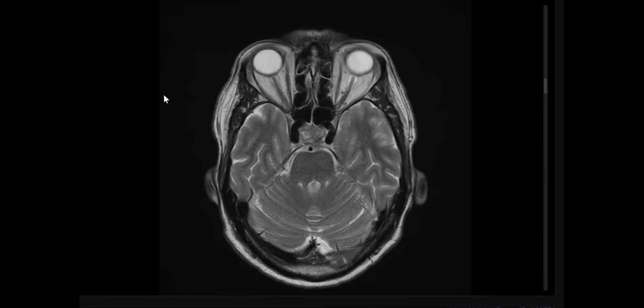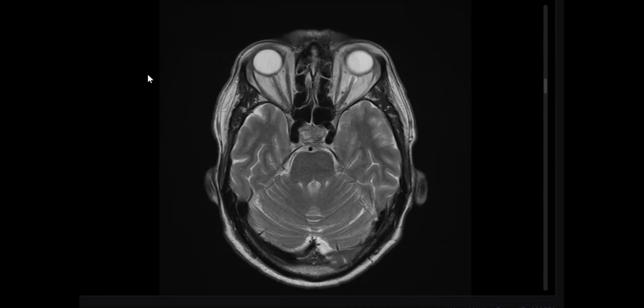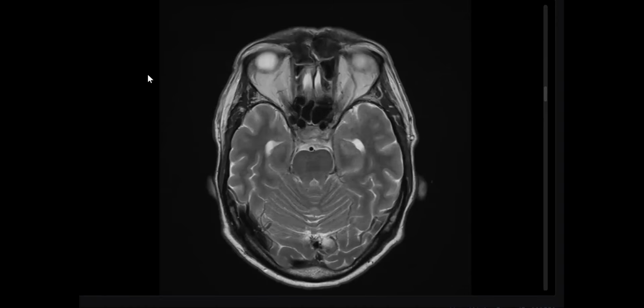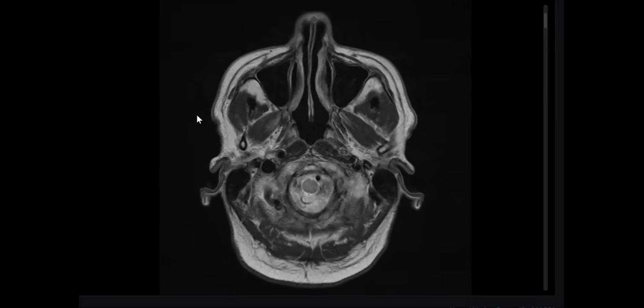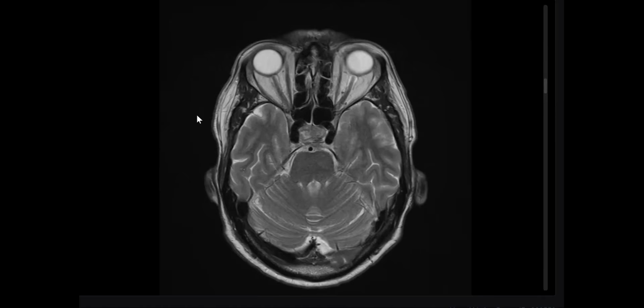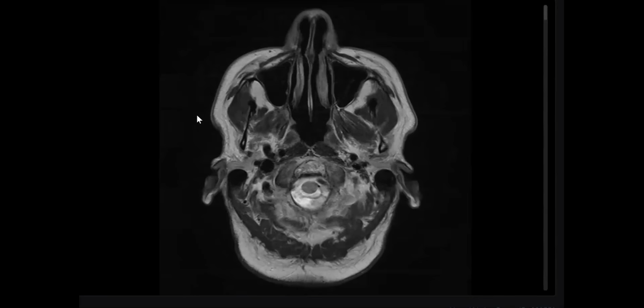For example, the venous sinuses, the suprasellar region, also the orbit, the brain cisterns, any vascular abnormality if I can spot something like this. I'm trying to check for the vessels here in the region of the internal carotid, also the basal cistern and the foramen magnum. I'm trying to spot if there is any crowding present or something like this. Yes, this is a start point, my friends. It's a very common hidden case in the exam.